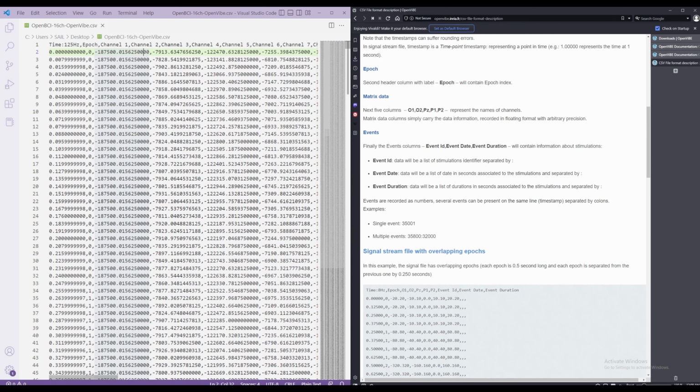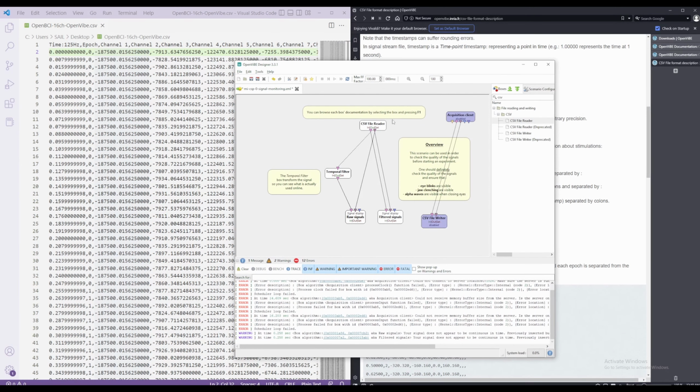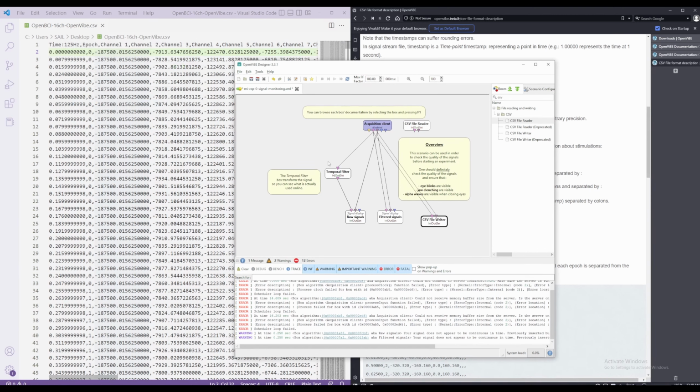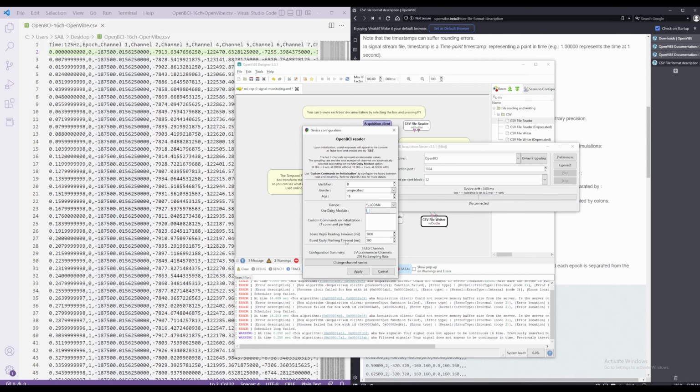So let's, for comparison, also record an 8-channel file using the same setup. So OpenBCI with the Daisy module can record both in 16-channel and 8-channel mode. We can undo all of this. Let's disable this and new file 8-channel. So when you open the acquisition client and go to driver properties, you can uncheck this here. See, it says, if I check it, 16 EEG channels, 3 accelerometer channels, and 125 Hertz sampling rate.